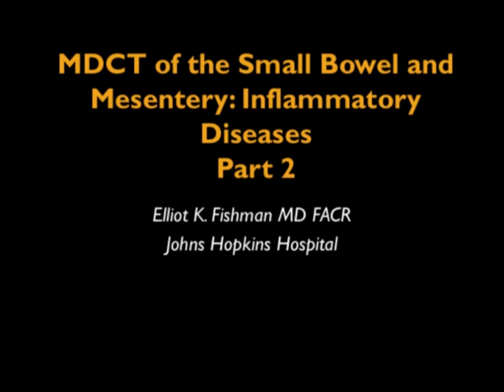And what I'm going to do in this section is basically focus on 3 topics. Small bowel and mesentery, as I mentioned, we could spend several days, but I'm going to look at 3 topics that I think are of interest. Now, remember in the last talk I spoke about Crohn's disease a bit, I spoke about small bowel obstruction, and one of the things I always think about when I'm looking at small bowel is looking at the vessels, because there are many things you can find.